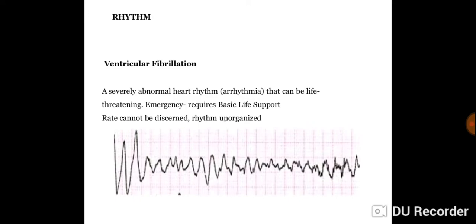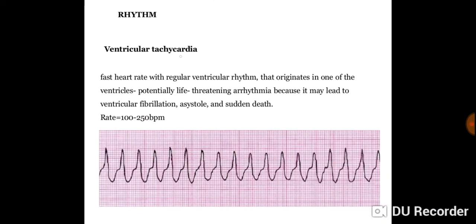There's no proper rate, no proper rhythm in this one. In a ventricular tachycardia, it's also an emergency. It's a life-threatening arrhythmia. It can lead to ventricular fibrillation if not acted earlier.